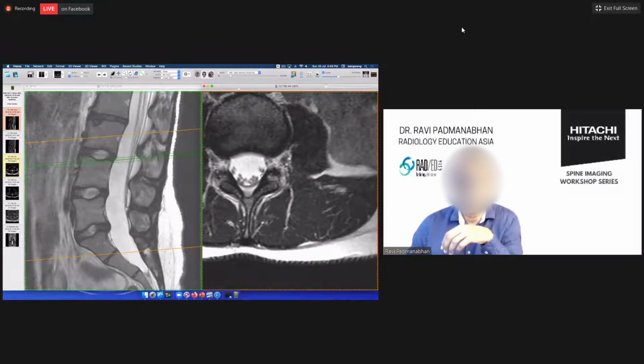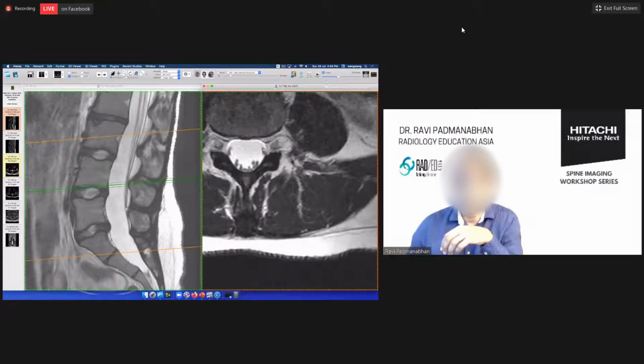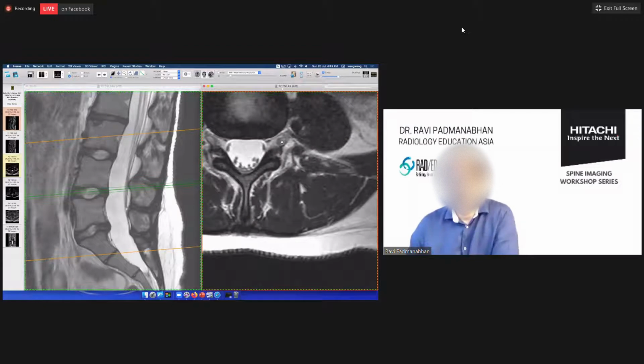If we go down to L4-5, here's the L4 nerve root that's gone out. This is the L5 nerve root that's within the canal. This is the traversing nerve root, and this is the one that will get affected if we have a cyst in the subarticular recess. The exiting nerve root will get affected if we have a foraminal cyst. Okay, let's go back to our PowerPoint.